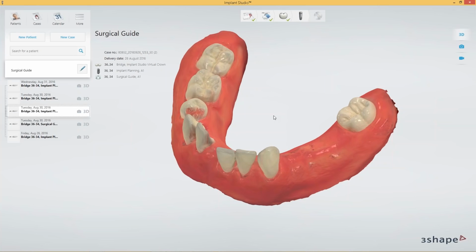And I think you're going to elaborate on why you have chosen the different guide designs in a few seconds. So please continue, Jan. Thank you.